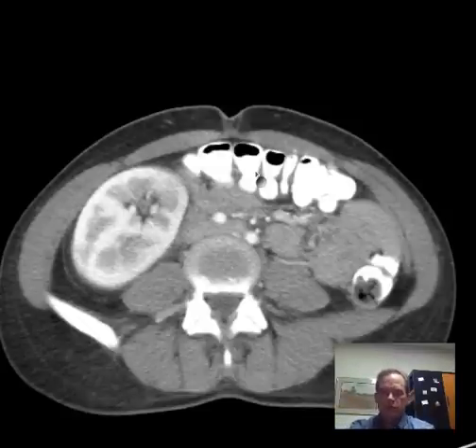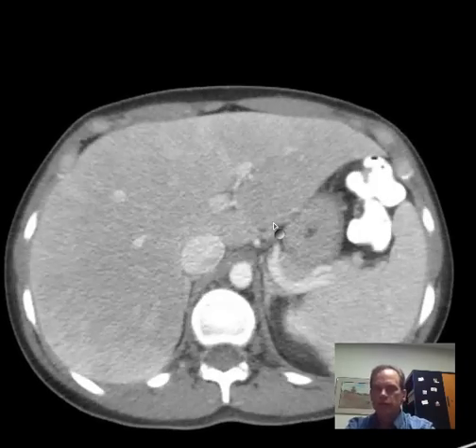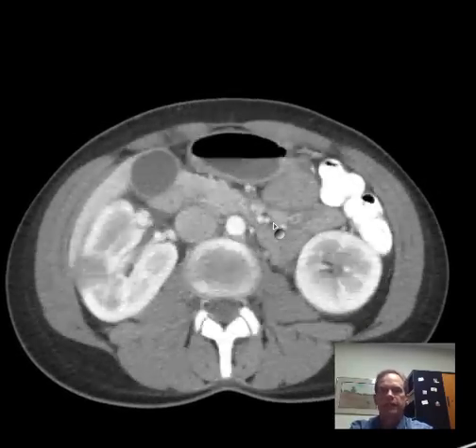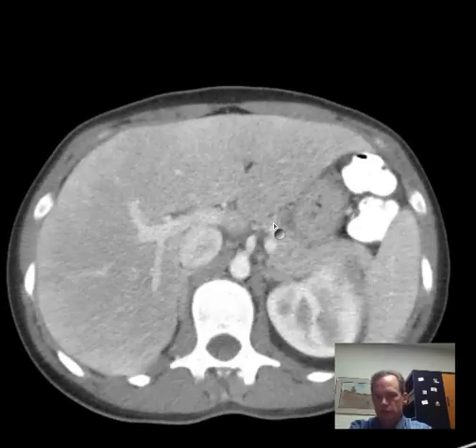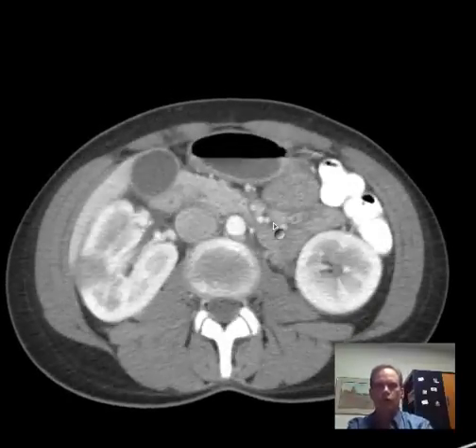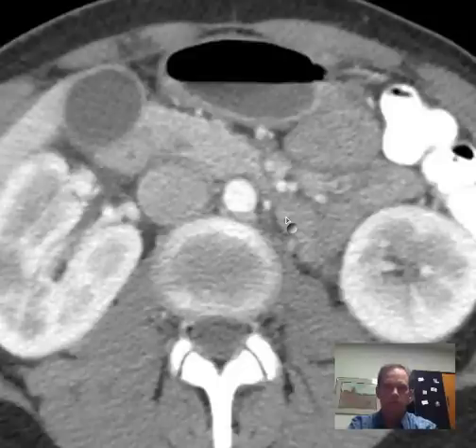Now this is one of my favorite GU diagnoses. It's something we weren't able to diagnose until fairly recent years with higher resolution scanning. This patient has abnormal kidneys. I'll just tell you that right off the bat here. Can you see what is the nature of the abnormalities?